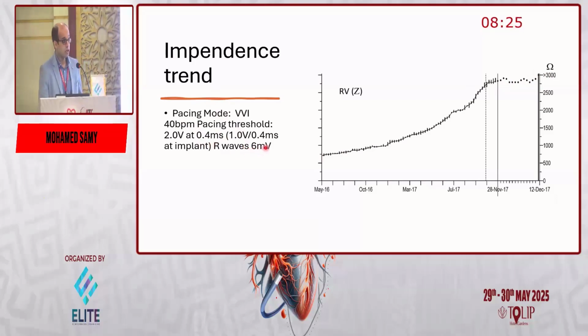Do I need any change for this device? Actually not. This is a clinical picture of the electrode myocardial interface. It results from a chronic inflammatory process, calcium mineralization of the tip of the electrode, and so I only need to follow up as long as I have good sensing and good pacing.